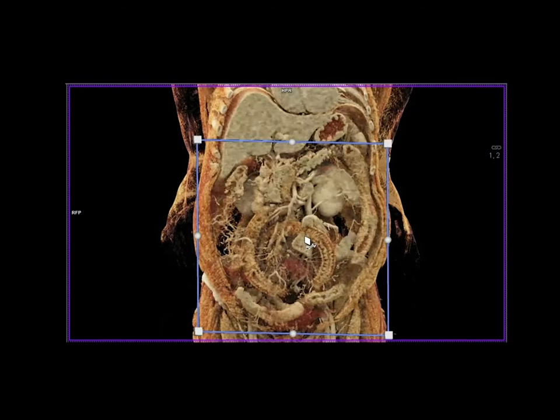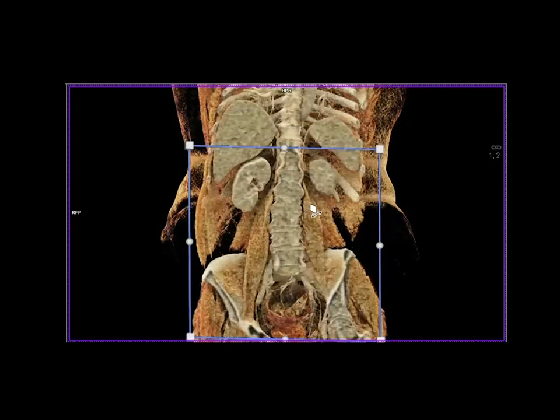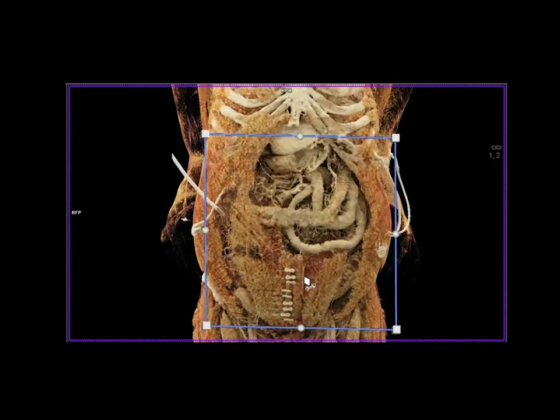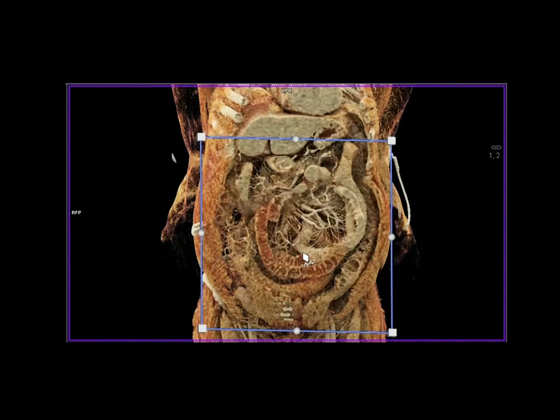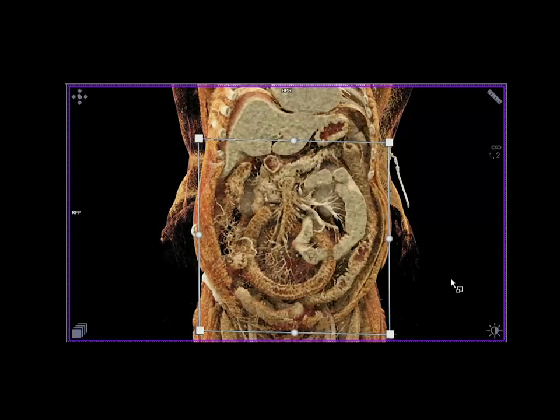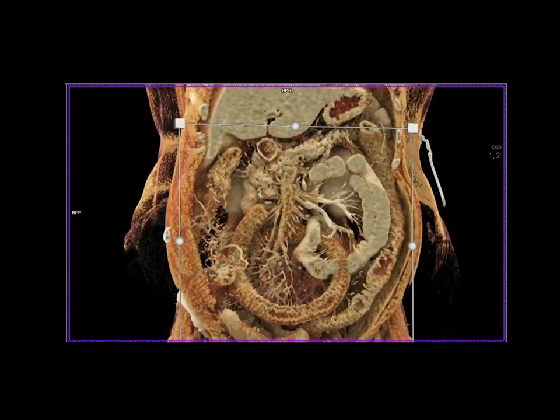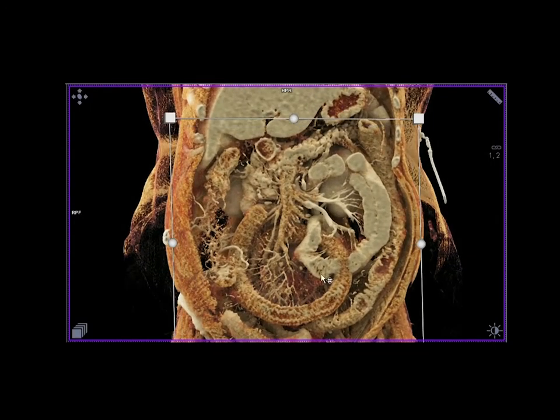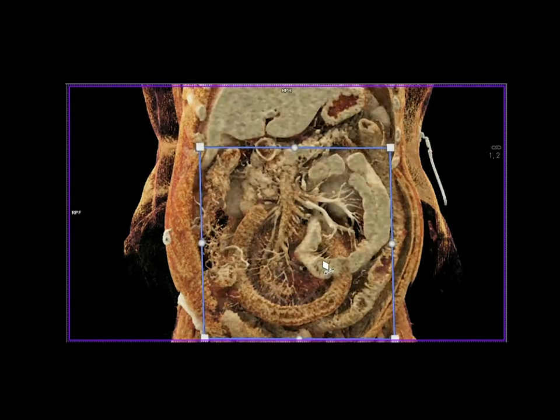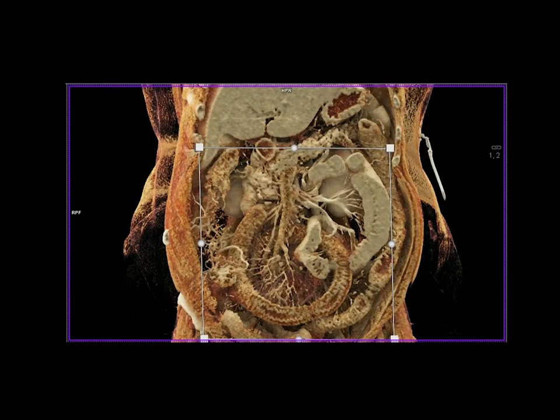And again, doing this interactively is pretty impressive, but again, look at the kind of detail as you cut through the bowel, as you rotate the bowel. All of this becomes indeed very, very important. So it's something we are doing and we're looking at very carefully. And across a range of inflammatory and ischemic bowel, cinematic rendering is proving to be very, very valuable.